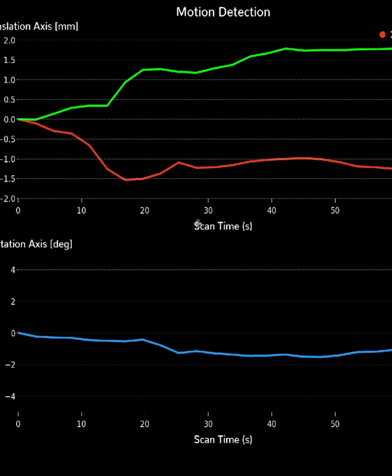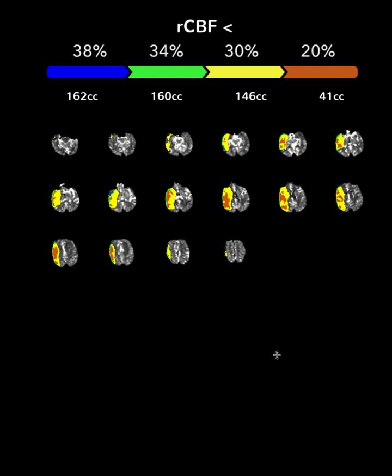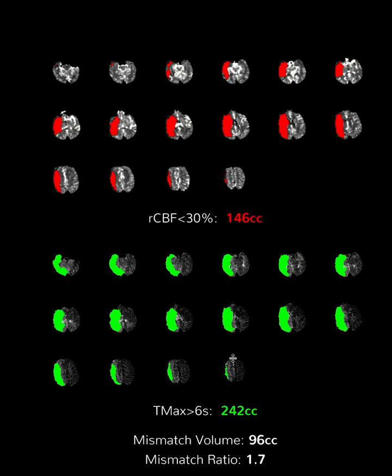There are quality control maps that show how much reliability you can put on these data, because this patient might have had a lot of motion, and you see there's some motion degradation on this. Also on these scales you see that there is some truncation of the arterial input and venous input. But still, I'm going to look into the data to see what it shows me. Okay, we go to the end of it.